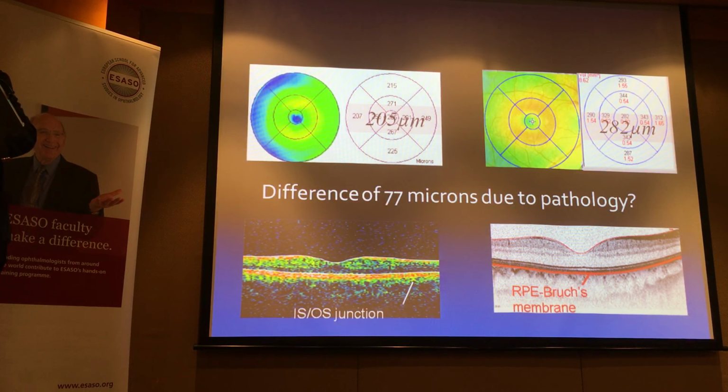What made you recognize? What was the clue? Is there anything that clue on this? The map looks a bit different, right? Yeah. Okay. Good. So that's one of the things. Of course, sometimes the display changes as well, but nonetheless, the point is this: be careful what machine was used.